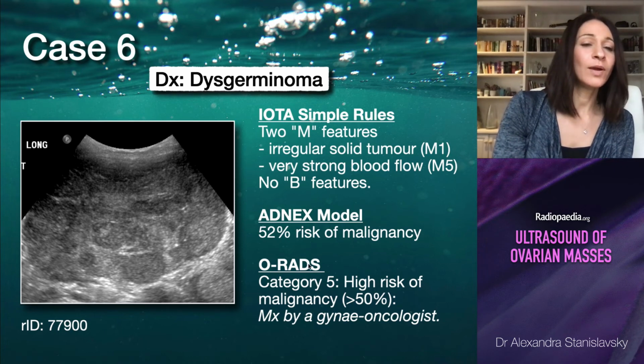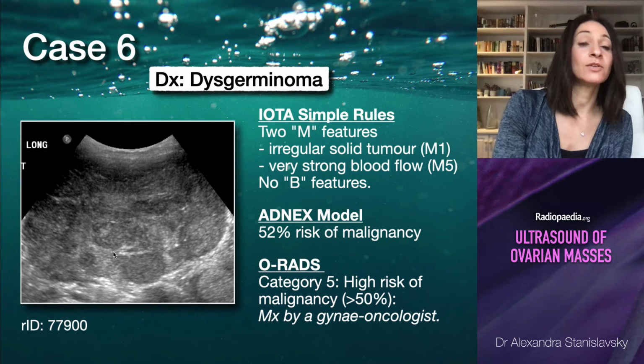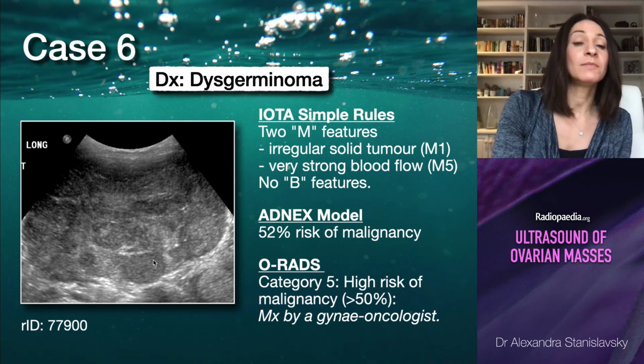is when you actually look at the stromal appearance of this lesion, take note of these echogenic bands that extend between what appears to be separate lobulations. So it's got a lobulated contour, and it's also got an internal lobulated appearance. It almost looks like a cirrhotic liver. And this is what the tumors look like histologically as well. So they've got these multiple lobulations with bands of tissue between them.